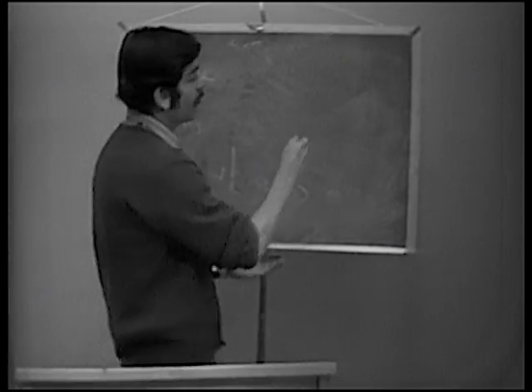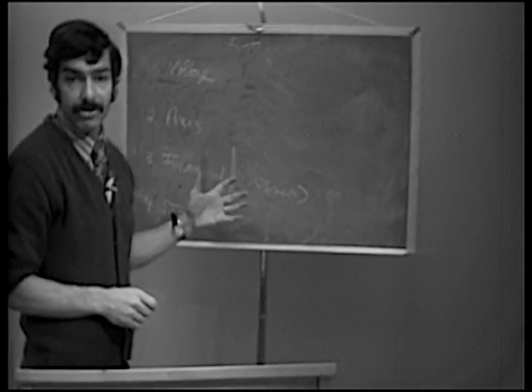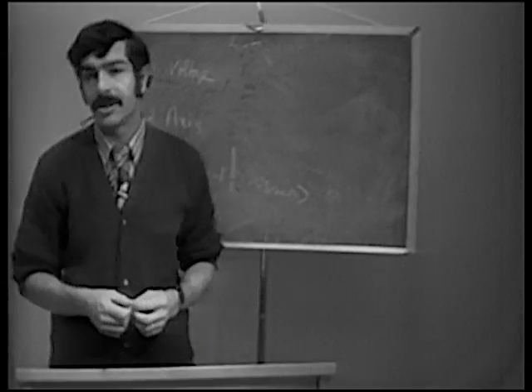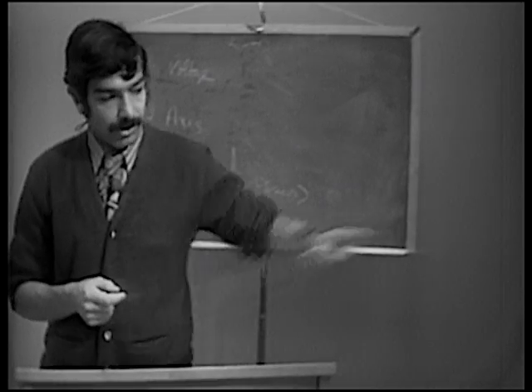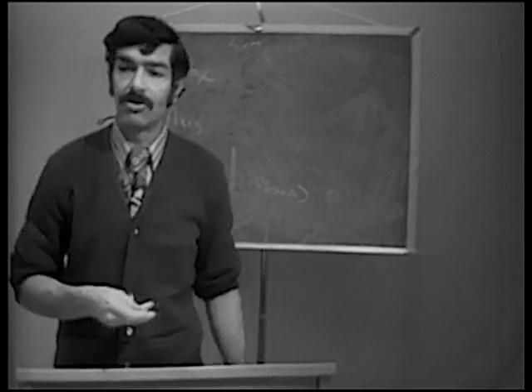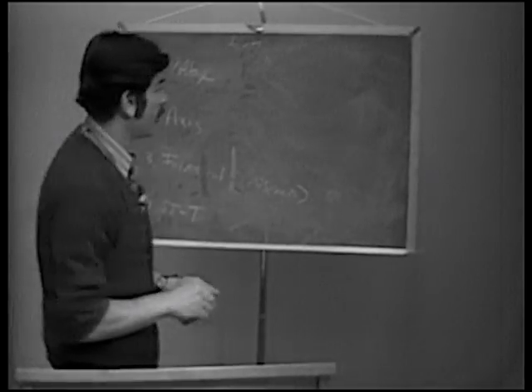Okay, now these changes in left ventricular hypertrophy, as you might expect, should be seen over the left ventricular leads. And what are the left ventricular leads? That's leads 1, AVL, and V4 through V6. So these are the leads where you'd expect to see these ST-T wave changes.